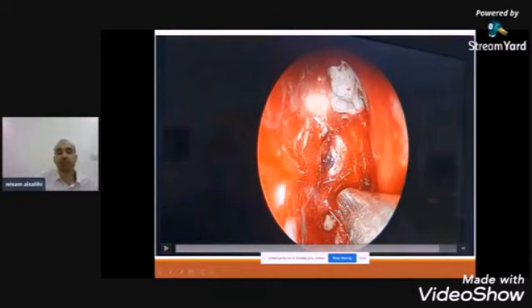This patient complained of a skull base defect. This is a very large defect. This is the nasal septum. This is the left side. This is the nasal septum. This is the lamina papyracea. This is the frontal sinus and recess. This is the sphenoid. And this is the skull base defect. This is the side of the cribriform plate. And I resected all the middle turbinate.